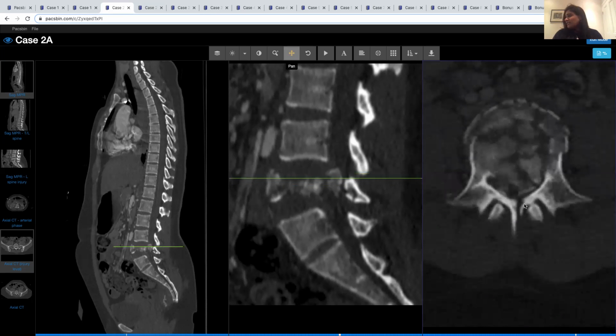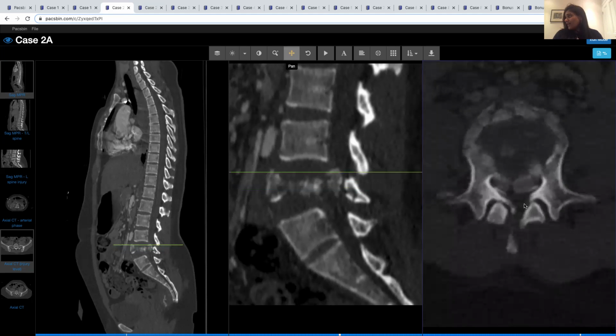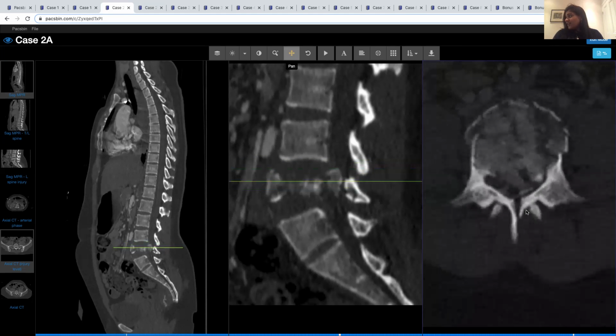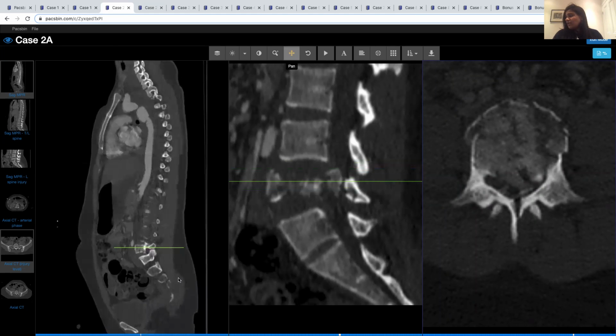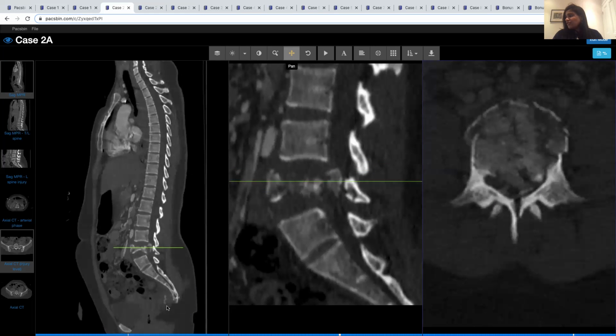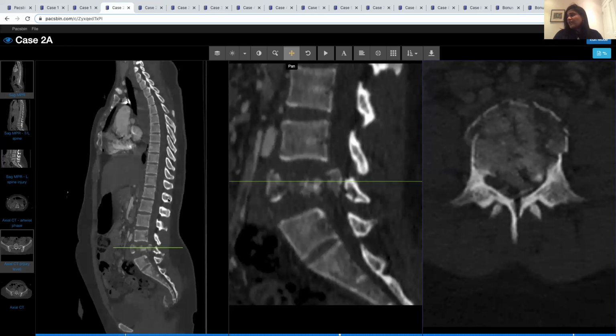So there's likely to be a severe injury at that level. I mean, it is at L5, but there's likely to be a cauda equina injury at that level, and there indeed was. And you can see associated that there is that interlaminar crack that's often associated with these burst fractures. The reason I thought this case was important to show was because this patient has multiple other injuries. You can see that they have a fracture of the lower sacrum and sacrococcygeal junction that's complex. There's pelvic visceral injuries as a result of that complex fracture.